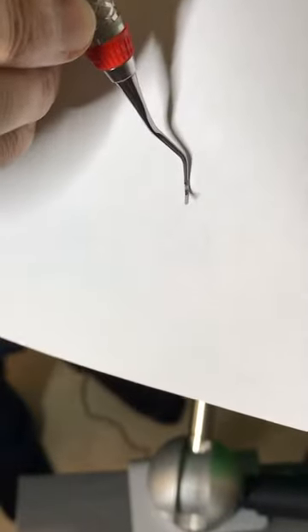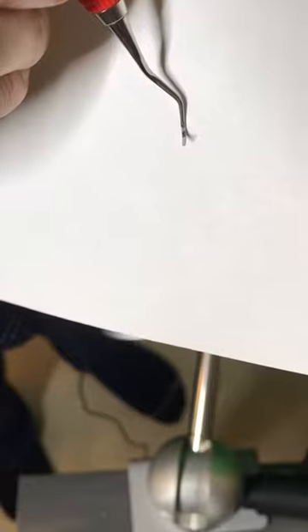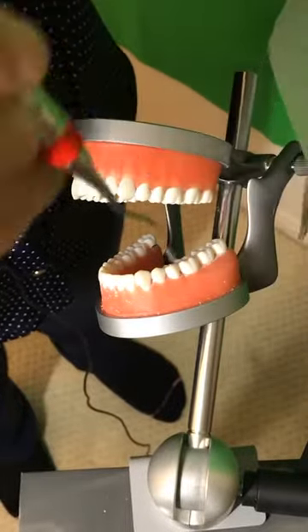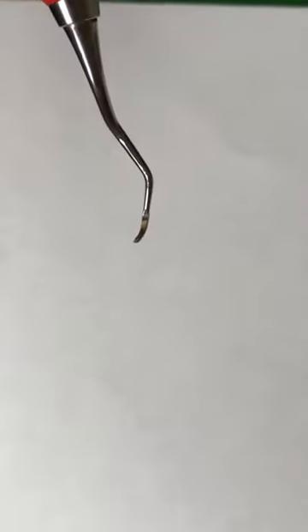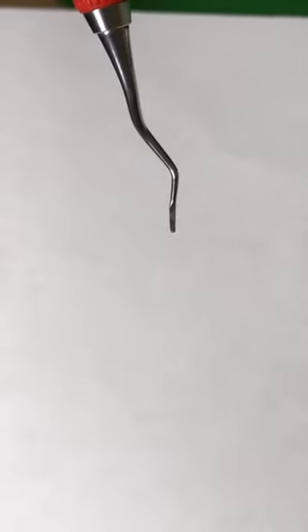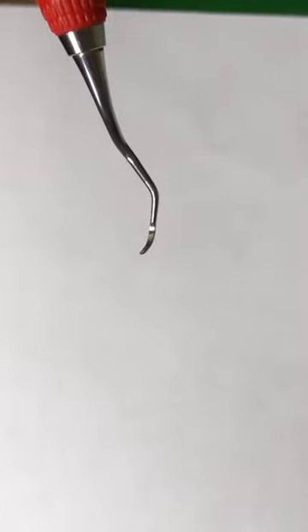I want you to put this terminal shank perpendicular to the floor, and then you will see one of the cutting edges is more slanted. That's the end to use for the cutting edge. I don't know if you can see. If you're looking at it from your screen, the slanted side is actually on your left side. The left side of the screen should be the slanted side. So that's the cutting edge.